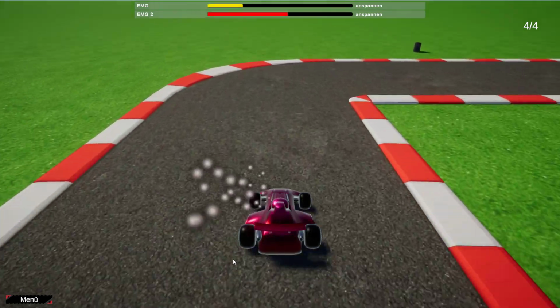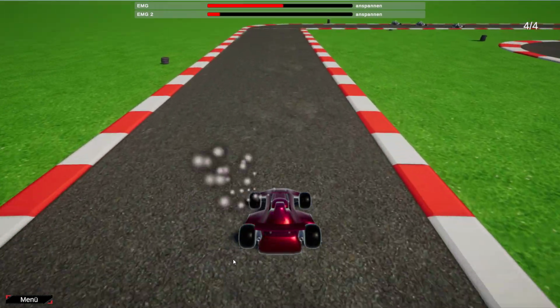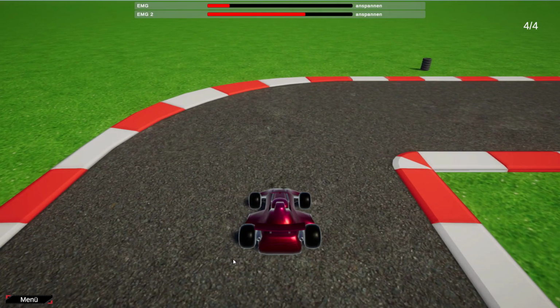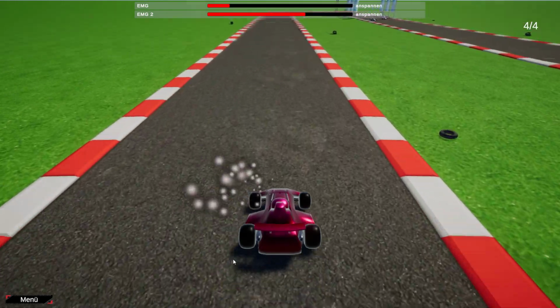They're well ahead, but we are 1 round ahead of them, so there's a fair chance of us getting to the finishing line before the other cars. So let's see how this turns out. Just a little bit more track to cover. Still in the red here.